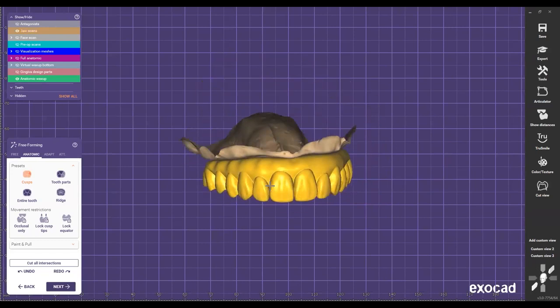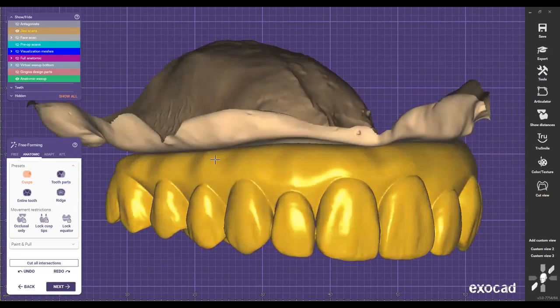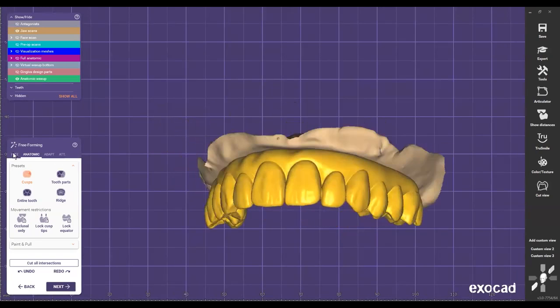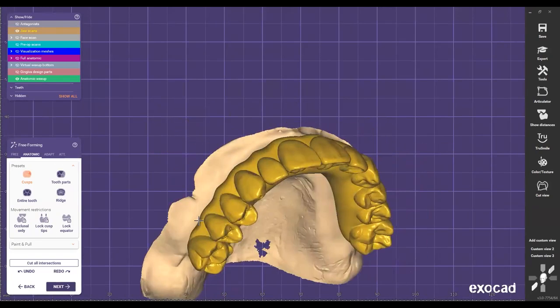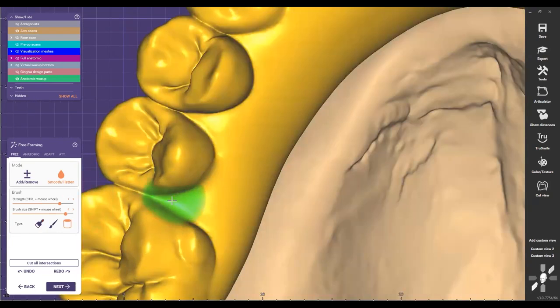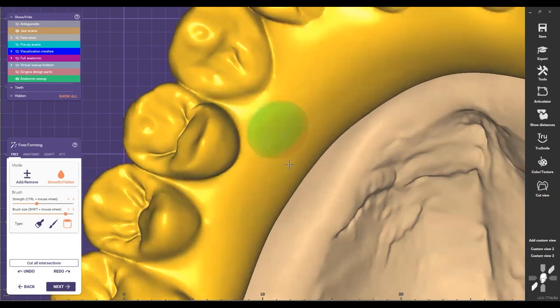It has happened to me that I make nice tissue, and then when I get the tissue from surgery, I say, oh, my tissue is up to here, and then I have to smooth all that and destroy it, right? So now on the lingual, what I like to do, in this area especially, is start making this right here. Not too much, but less. So I just create a nice reinforcement there.